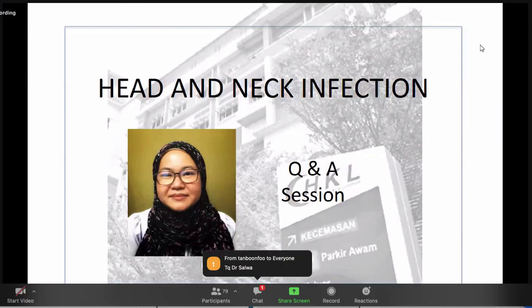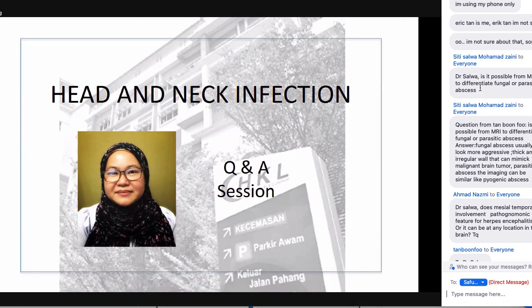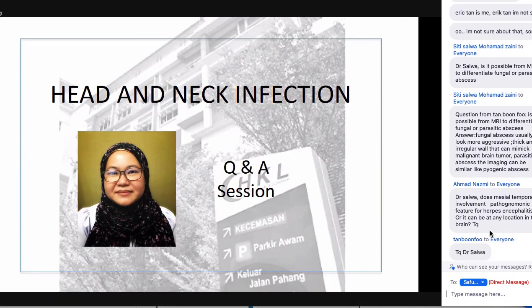When the surgeons went in to drain, these fluids were actually pus. So on CT, it can get quite confusing. You may see fluid attenuation, which appears as edema on CT, but it's actually purulent material. Yeah, I think that's all for the first question.